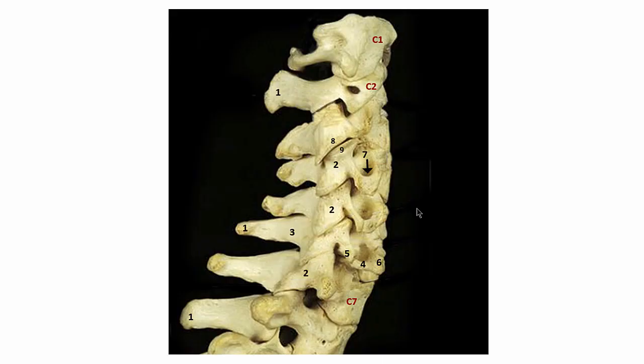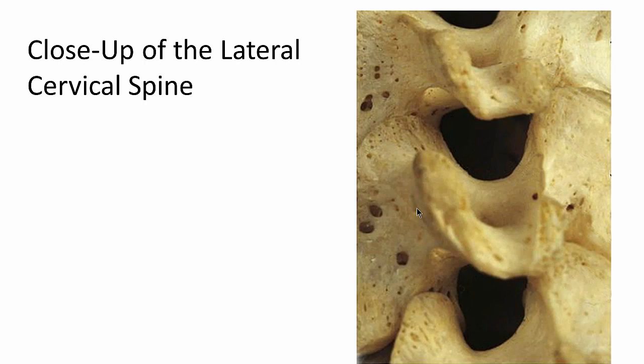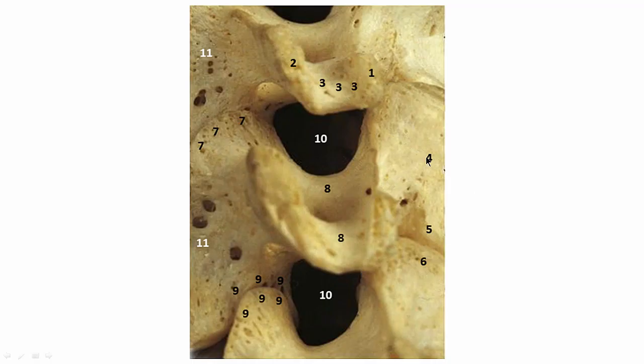Close-up view. Didn't I give you the answers? I thought I gave you the answers there. Well, I just did. Here's a close-up view. Again, you can see how this is formed. I think I have numbers on this one.